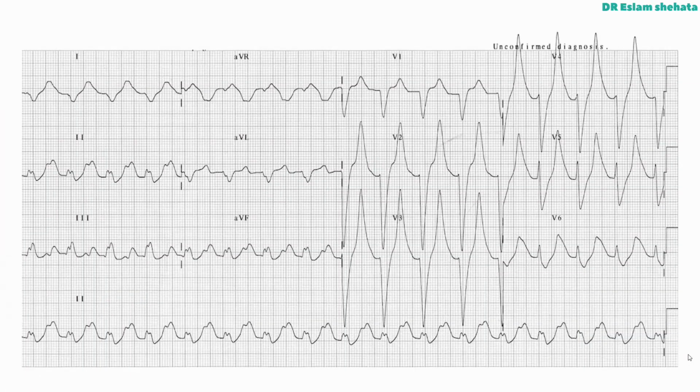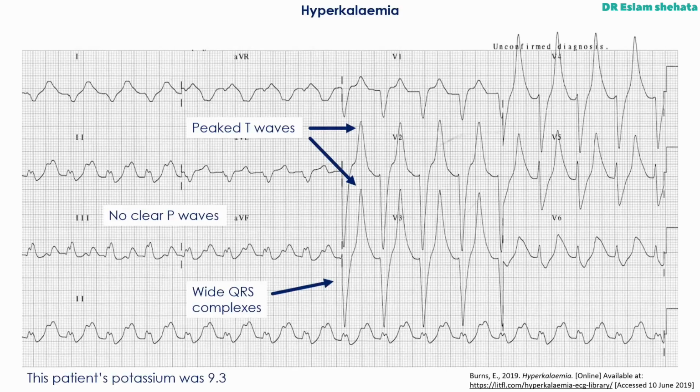Okay, here's another example. I'll get you to pause the recording and decide what you think is going on. So this is an example of hyperkalemia.